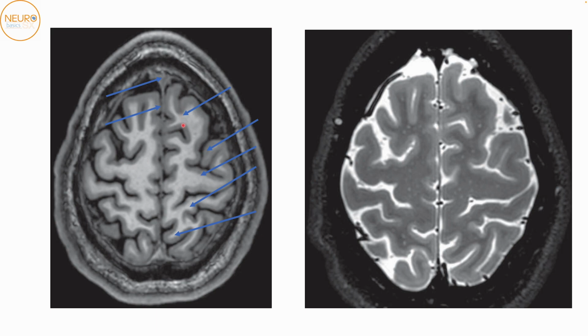Right. So we know that anterior to the precentral gyrus, superiorly, you would only have the superior frontal gyrus. So this entire thing is the superior frontal gyrus. This here is the middle frontal gyrus, and this is the superior frontal sulcus. Precentral gyrus, postcentral gyrus. This here, behind the postcentral gyrus superiorly, is the superior parietal lobule.